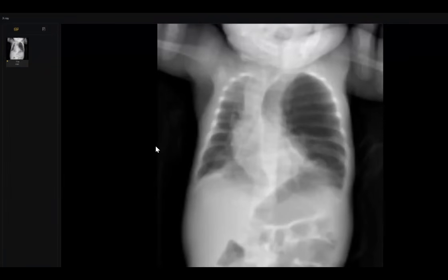Sir, this is a chest X-ray frontal projection of pediatric age group in which I can appreciate the left lung field appears transradiant, hyperlucent, and it shows contralateral shift toward the right side. So this abnormality is lying in the left chest field. I'm suspecting this might be a congenital lobar emphysema. I have a few differentials. My first differential is congenital lobar emphysema.